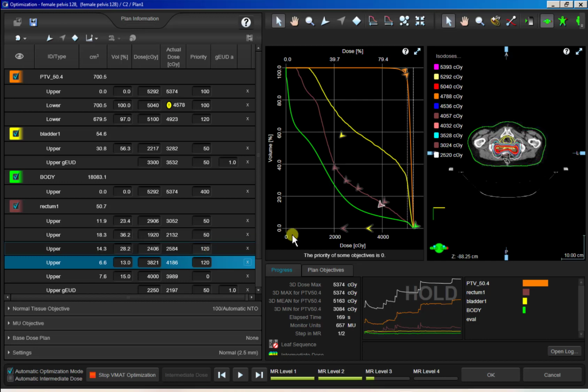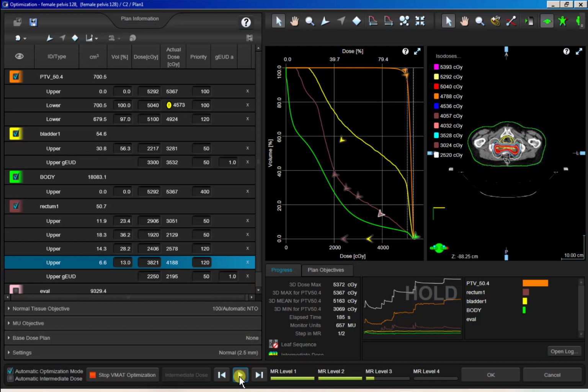You can, of course, if these are must-have constraints that we just have to meet, keep pushing on these. But I think at this point, since we're not seeing any improvement after I make that push, we're just going to start losing coverage, right? So let's just let this play on through. So both of these, if we're not meeting, we're very, very close.